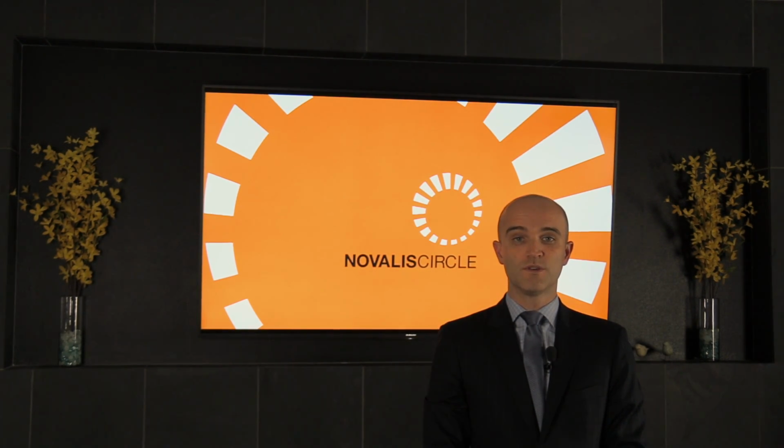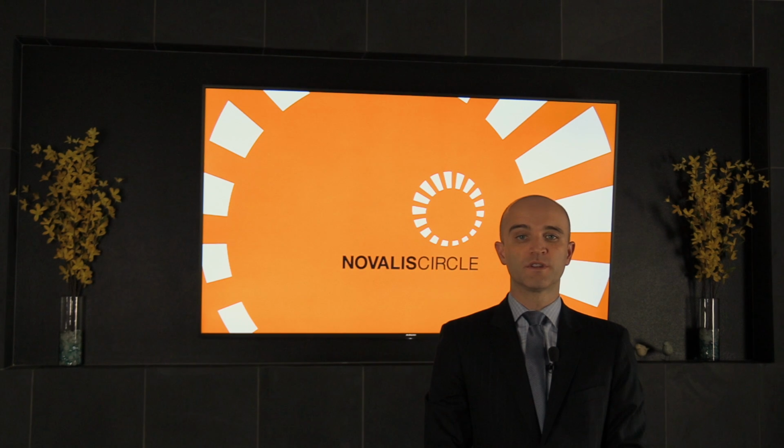Today we want to show you how to plan an easy case with our brand new multiple brain mets SRS element. Today we have prepared a video that will guide you through all the necessary steps on how to plan with our new software. Following the video, you'll have the ability to send us questions and we will gladly respond.